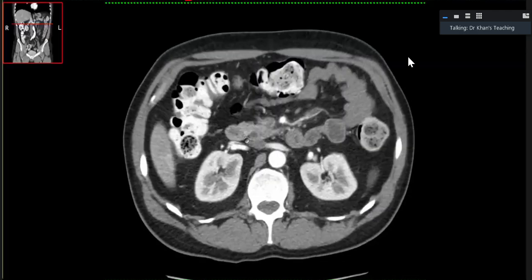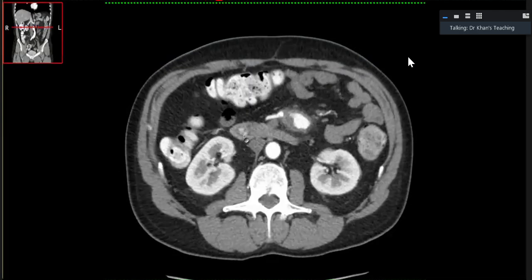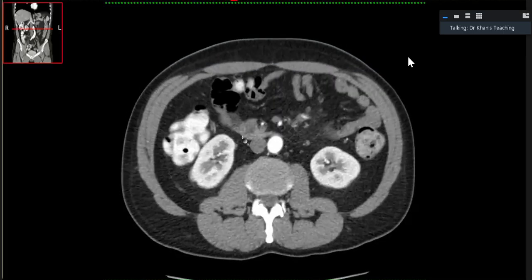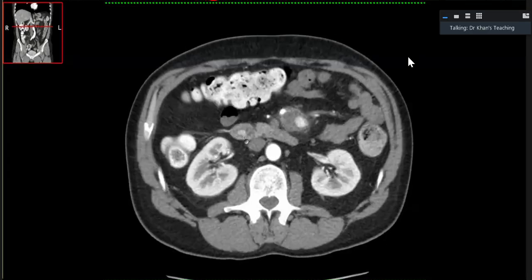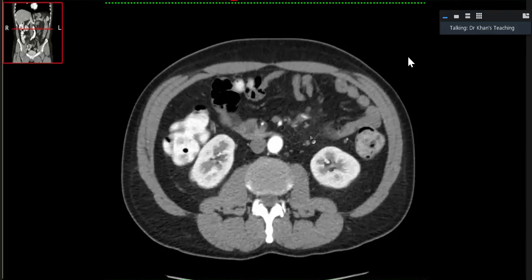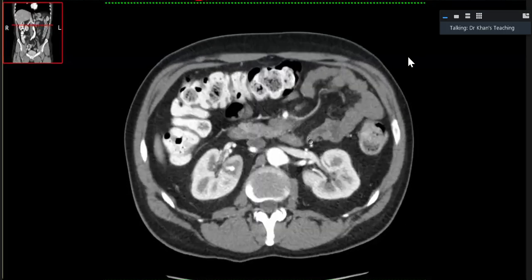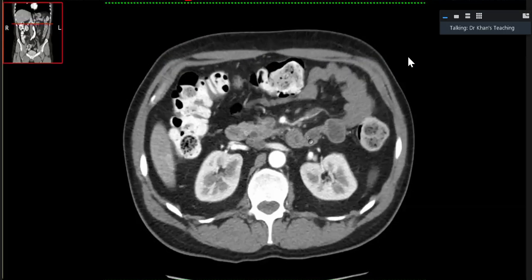you do next? So, of course, the gastroenterologist can also tackle it if you've got a service, or the IR can tackle it. Okay, what else is happening here? Otherwise, your diagnosis is correct, but this was a very, very important thing, clinically speaking. Now, in this case, I have now shown you a polyarteritis nodosa on a CT scan.